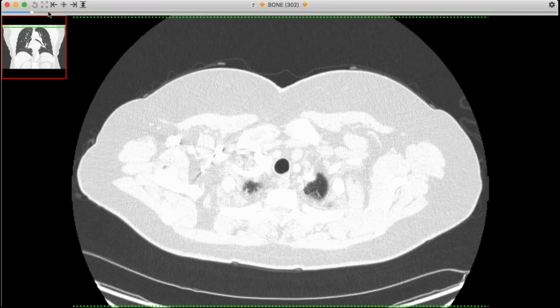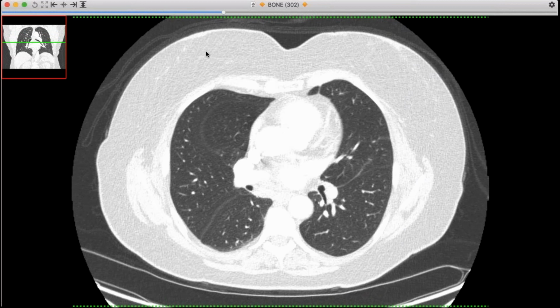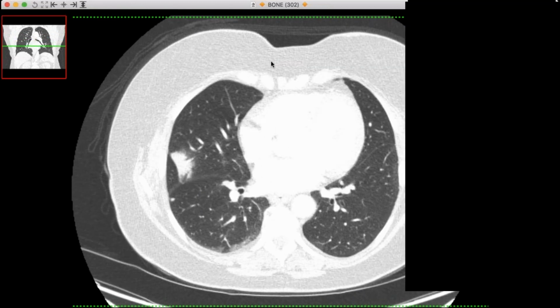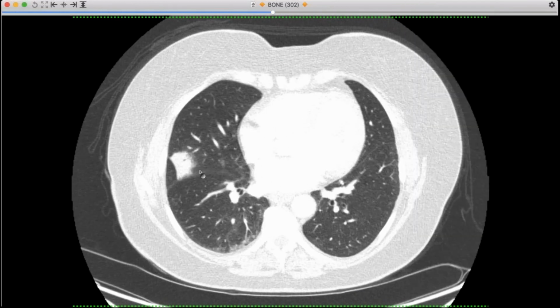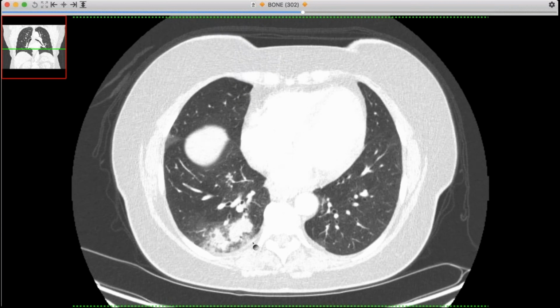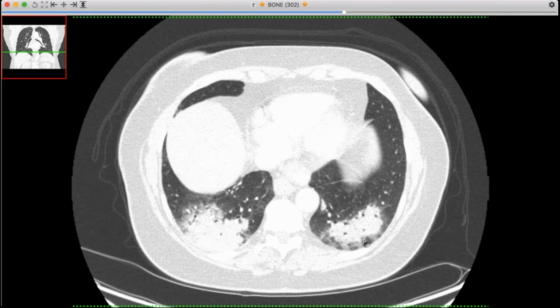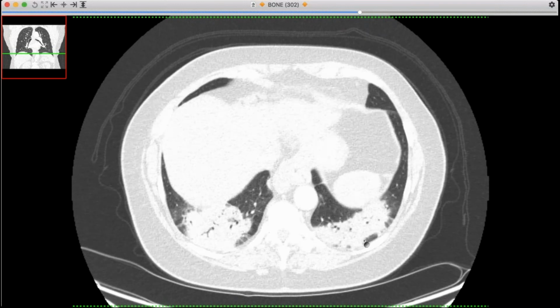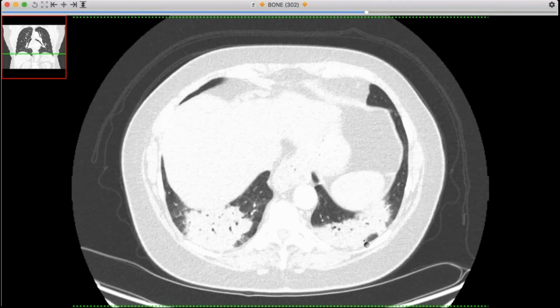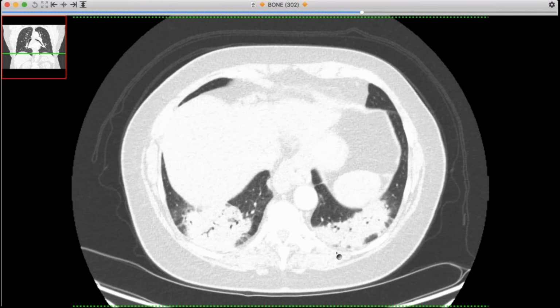I had found a bunch of scans going back, but this was a few months ago and was presenting with this mass-like area in the middle lobe and then another mass-like area of consolidated lung in the right lower lobe. And you can see there are air bronchograms, and there's a little bit here in the left lower lobe. And I think one of these scans was done somewhere else, and this was called infection, and no effusion or anything like that.